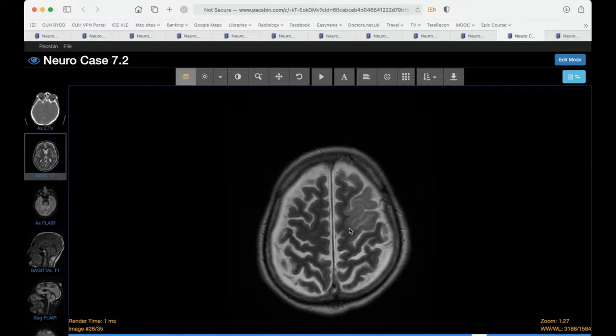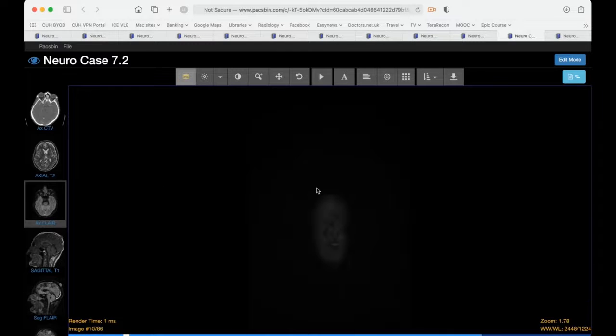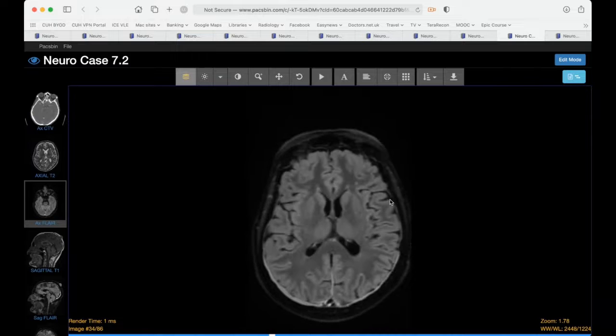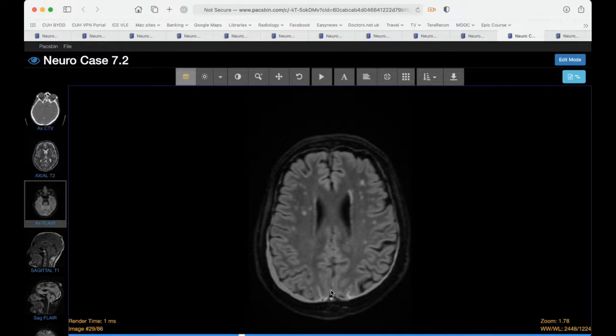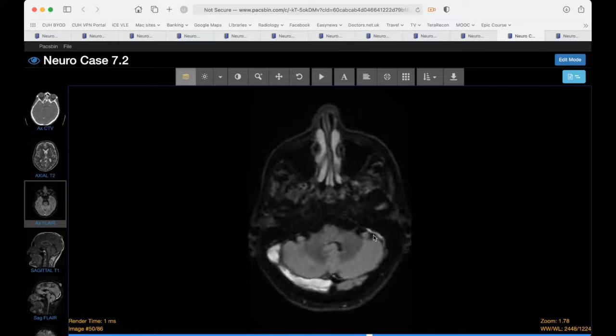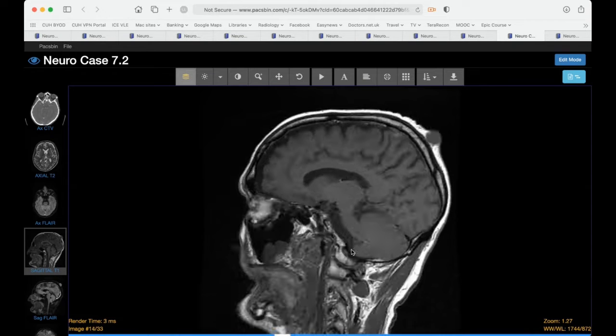Notice here in the left frontal lobe some cortical swelling. That should also be quite apparent on the FLAIR. This is a 3D FLAIR. Here you've got your subdurals very nicely seen and the cortical swelling that we saw earlier. Have a look at the signal change within the superior sagittal sinus and this very marked hyperintensity in the right transverse sinus. Here's a sagittal T1 before contrast.